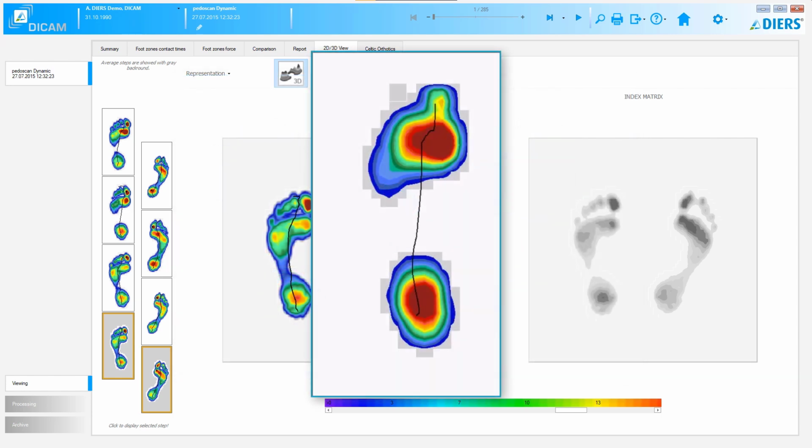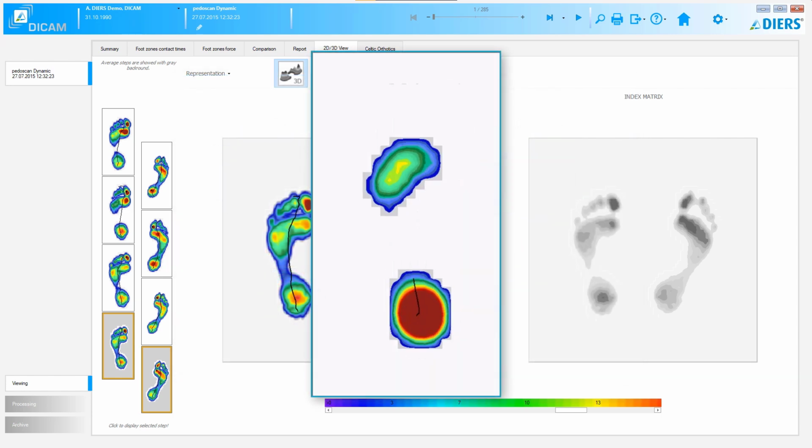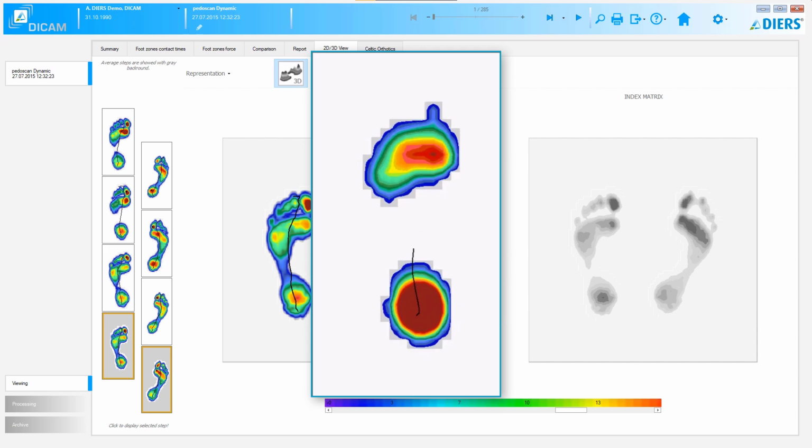In many cases, the functionally characterized pes valgus shows a completely inconspicuous heel composition. As expected, the COP line runs centrally towards M3 after initial loading of the lateral heel. The excessive eversion then occurs only at the moment when the line leaves the area of the heel and passes into the midfoot. If we recall the course of the ground reaction force, this coincides with the first force maximum and the accompanying end of the loading response.